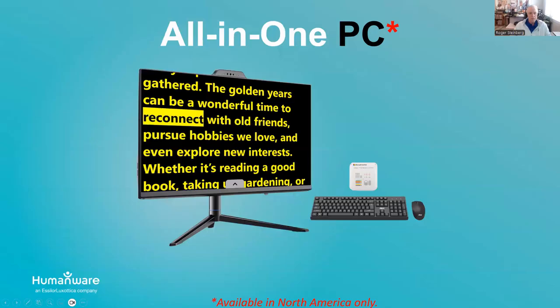And then the last option that we offer, and this one is only available in North America, so that would be US and Canada, is an all-in-one PC option. In this case, you have a 24-inch all-in-one PC that you see here to the left. It's actually got a document opened using one of the available contrasts in Prodigy for Windows, and that would be being read on that screen.